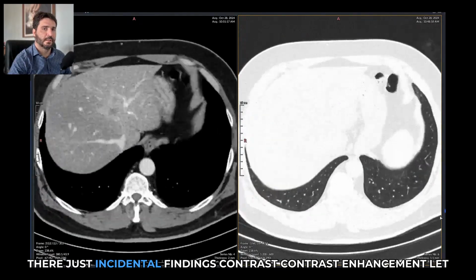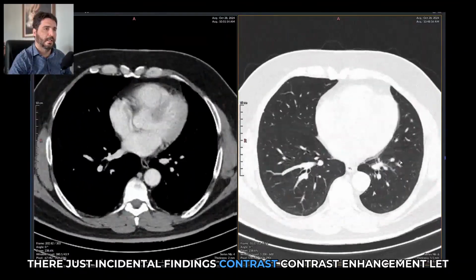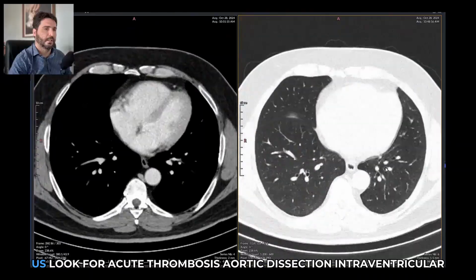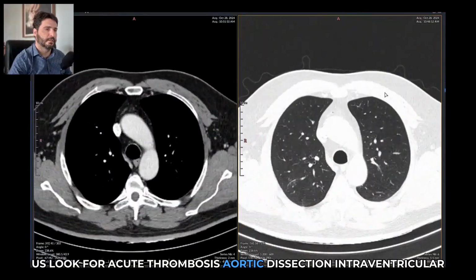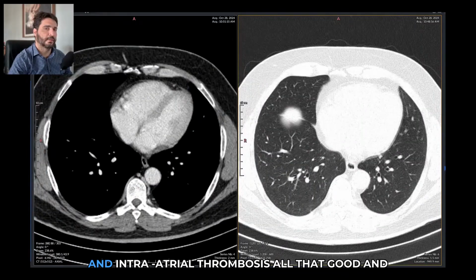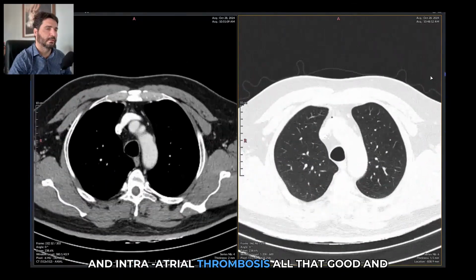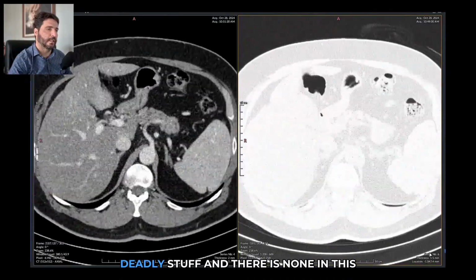Just incidental findings. Contrast enhancement lets us look for acute thrombosis, aortic dissection, intraventricular and intraatrial thrombosis, all that good and deadly stuff.